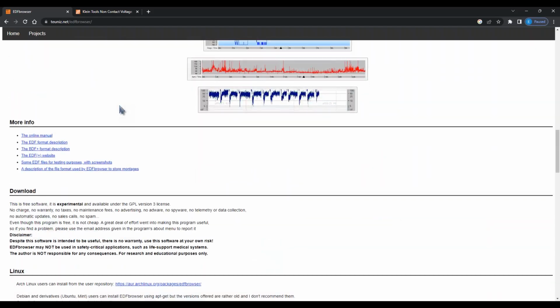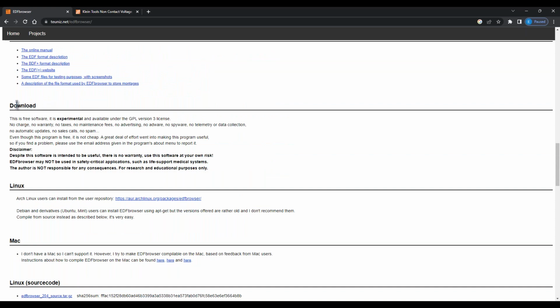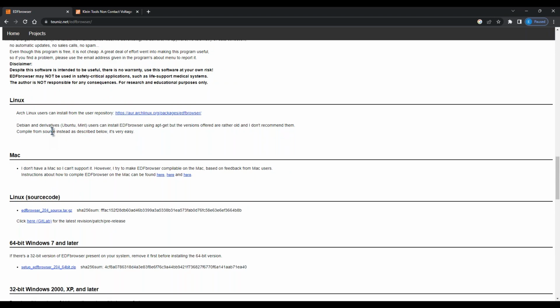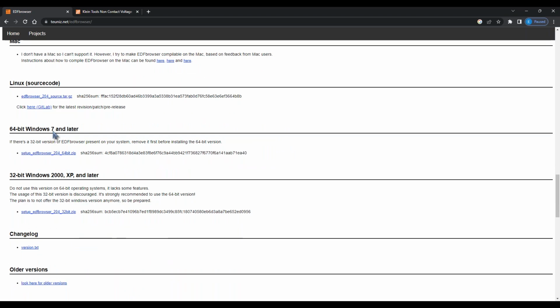Let's say you were running a specific session on a client and you noticed some weird anomalies happening, and you wanted the ability to play that session back and look at it in detail. There's a couple little steps you have to do to get that accomplished.